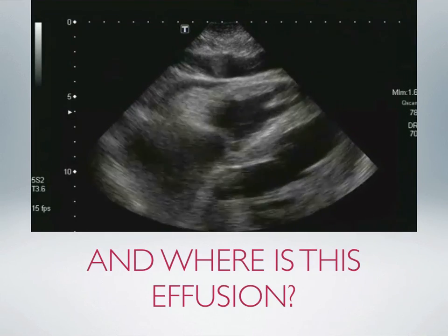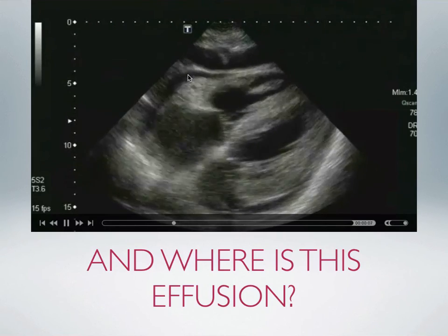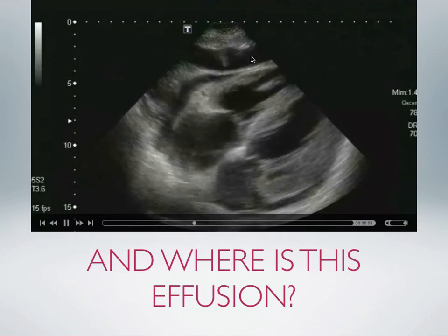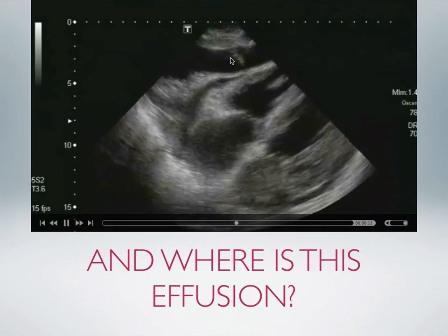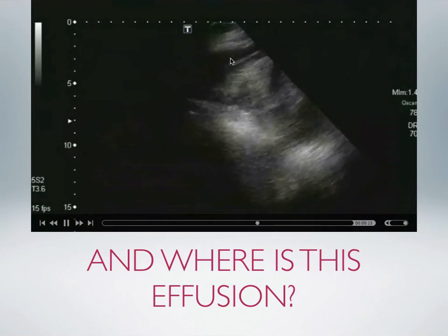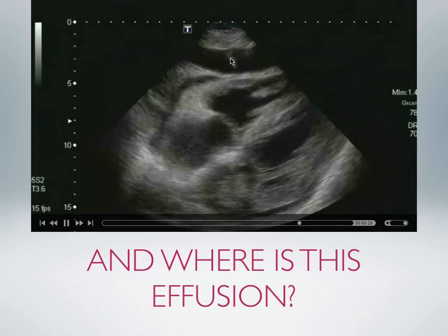This is another image with the same question. Where's the effusion? Small effusion up here. Liver, ascites, with a piece of omentum hanging down here. So two effusions, the ascites and the pericardial effusion in a subxiphoid view.